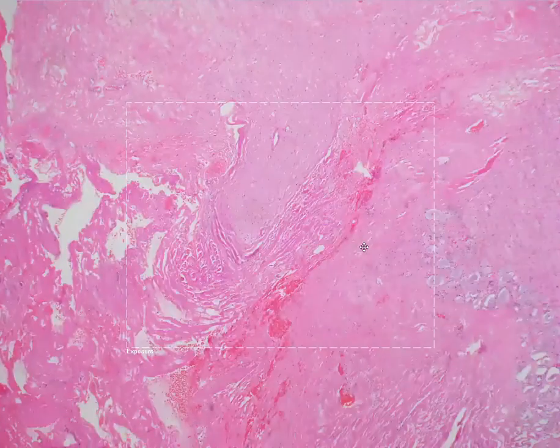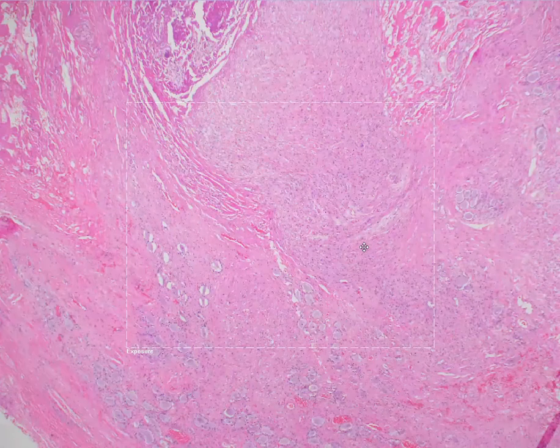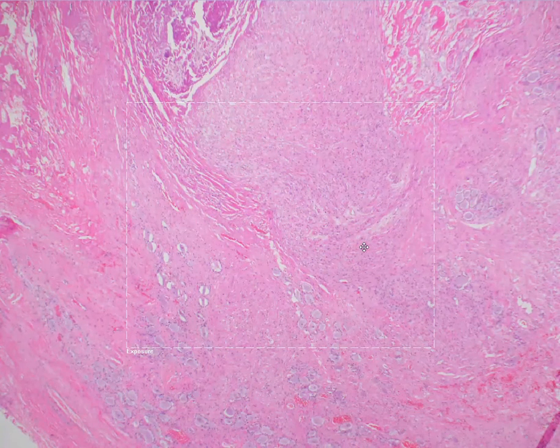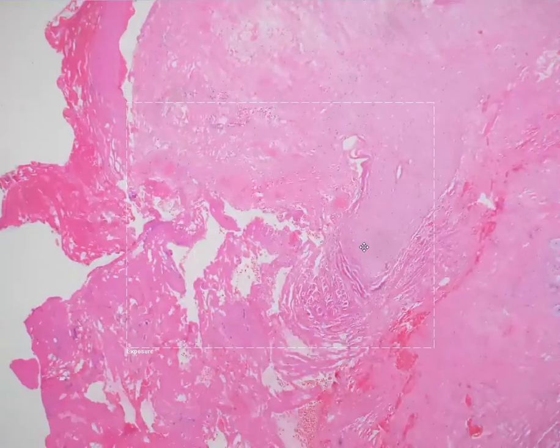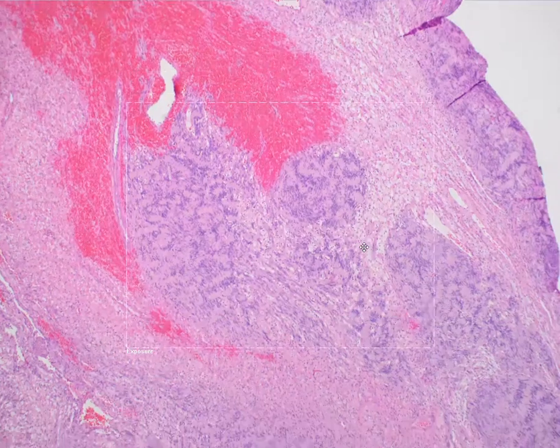The key features of a schwannoma then, other than the fact that it's comprised of Schwann cells and is typically encapsulated, are the two characteristic features, the Antoni A and Antoni B areas. So there's typically an Antoni type A pattern, which is comprised of a solid proliferation of Schwann cells. And those Schwann cells typically are organized in fascicles and cords. So I'm going to scan around and we'll try to find classic Antoni A areas.